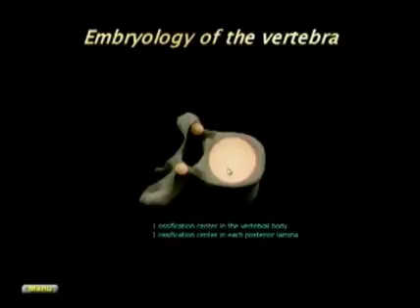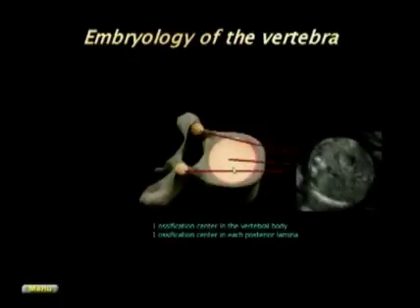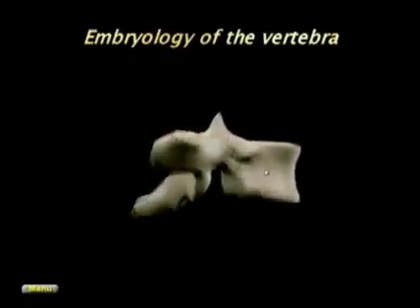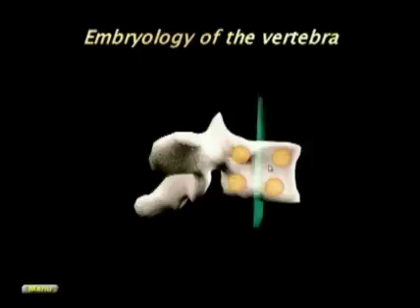At that time is what we see with the prenatal ultrasound around the second trimester. We see those 3 ossification centers, which represent the posterior lamina and the vertebral body. Now, as we know now that the central ossification center is made of several subunits, it is easy to understand the anomalies of segmentation of the spine. For instance, we could have a failure of the anterior and posterior ossification center to fuse together. That would be a coronal cleft.